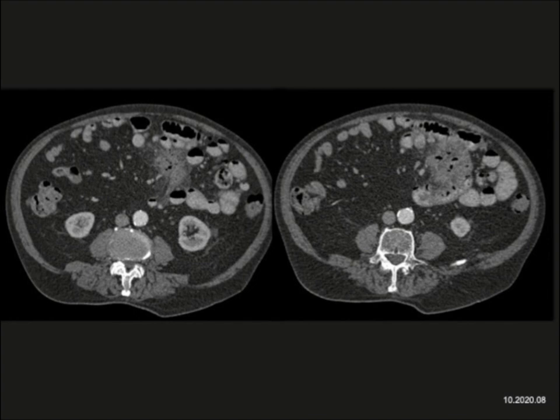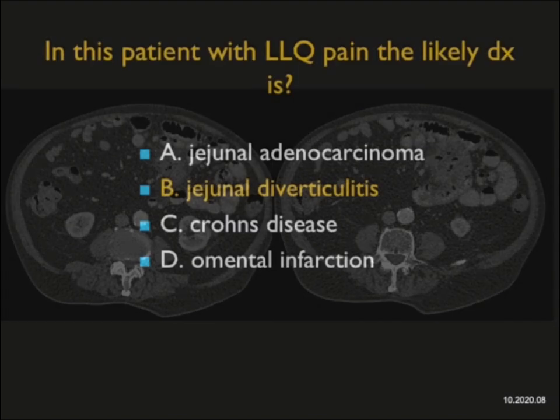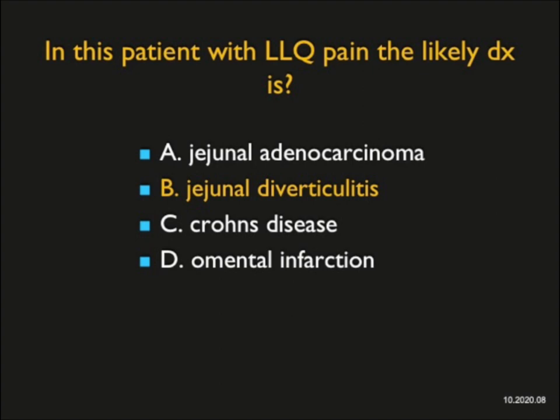We think about colon diverticular disease and diverticulitis commonly. We think about duodenal diverticuli, but we rarely think about jejunal or ileal diverticulitis. It's an uncommon process, but presents as acute inflammatory process, can be managed conservatively if you make the diagnosis. Obviously, it can be confused with a perforation of the colon. You could think about Crohn's disease or other inflammatory etiologies. Again, the mesenteric component is critical, but also the outpouchings of air, which at first you say maybe it's just free air. Then you realize you're dealing with diverticuli, and this was jejunal diverticulitis, a wonderful case.